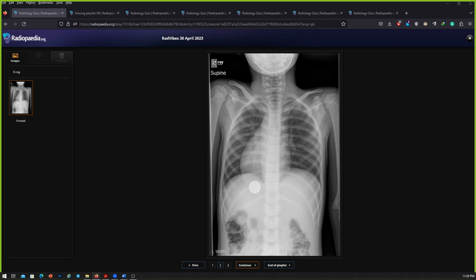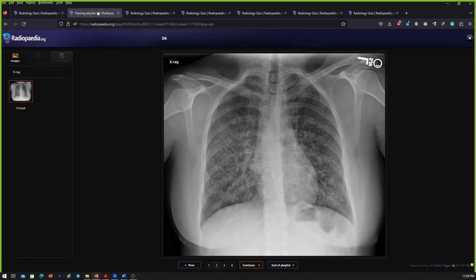Based on that, most likely this patient has dextroposition of the rest of the organs as well. As I can see, the liver is anatomically located towards the opposite side, and the spleen is in place of the liver. So most likely this foreign body is lying within the stomach then. I would confirm these findings on the lateral views as well.